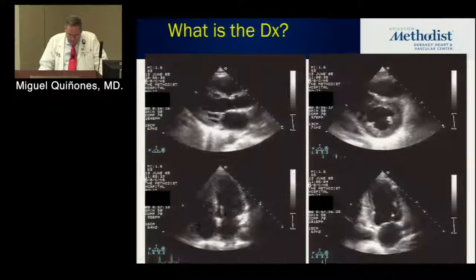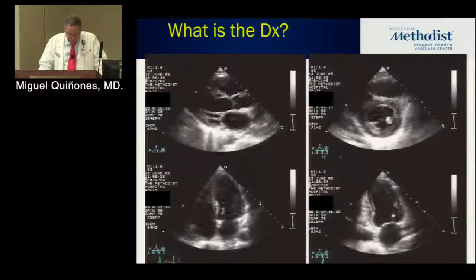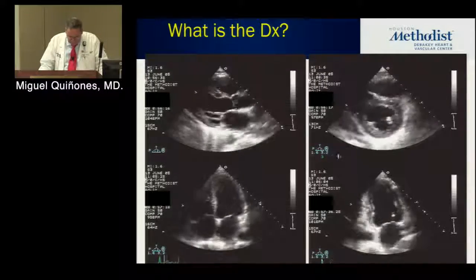All right. So, what do you think? What do you think this echo shows? Just in 2D alone. What do you see here? Is this a normal echo?